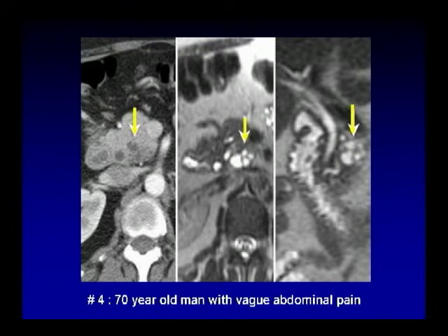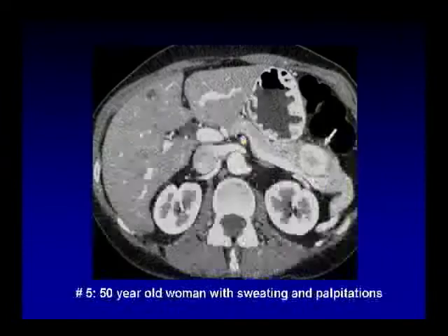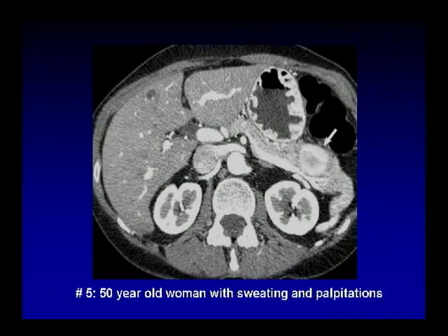I should have taken the arrows off just to make it more challenging for you. And last case, 50-year-old woman with sweating and palpitations.